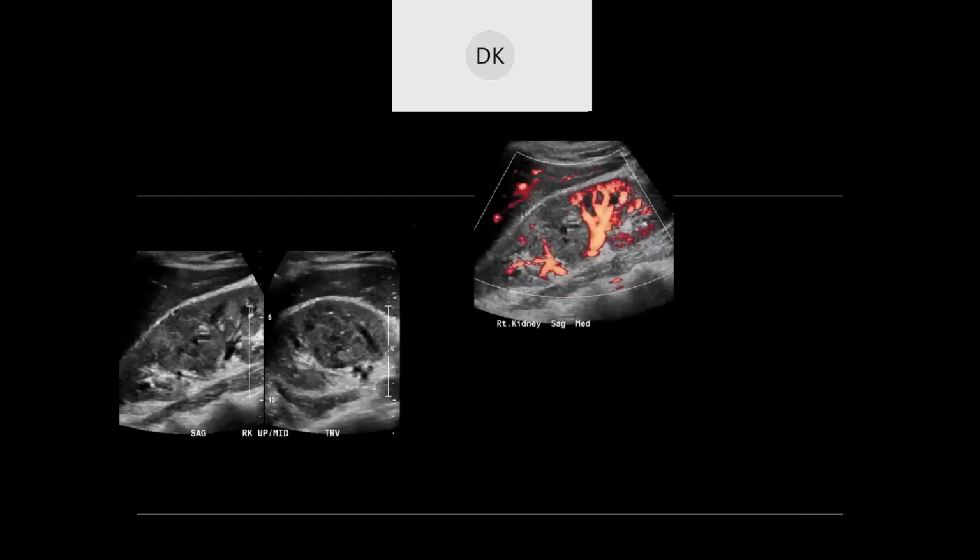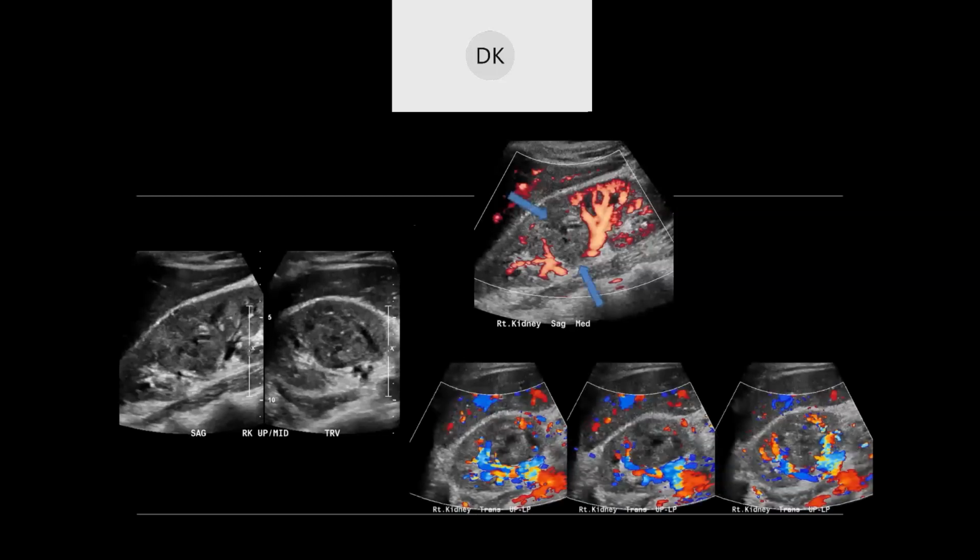So here's an example. This was a patient who had pyelonephritis, the right kidney here. You see this expansile area in the interpolar region. It looks a little isoechoic. It's nicely outlined on power Doppler imaging here. And then when we use color Doppler, we see that even more conspicuously as what looks like a cystic and solid mass. We have this area of liquefaction in the center there, that anechoic focus. And this is an example of a renal abscess appearing as a solid mass.